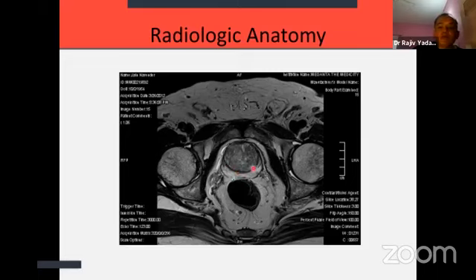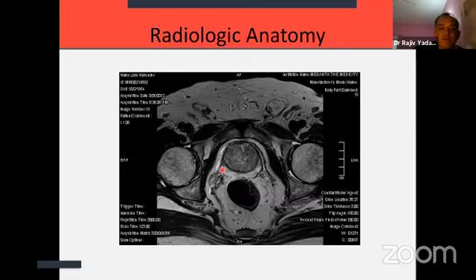So when we were doing BPH surgery, the open prostatectomy, what we used to learn is that this is the plane where they go. When we do a prostatectomy, the peripheral zone is left behind and the plane of dissection is the pseudocapsule. When we talk about the prostate capsule, this is separate. The prostate capsule is not a true capsule, but a condensation of the fibromuscular tissue around it, and it also looks black. So the lining outside the whole prostate is the prostate capsule, which anatomically or pathologically is a pseudocapsule, but still we call it the prostate capsule when we are discussing periprostatic spread. So this is the prostate capsule which we talk about in those cases.